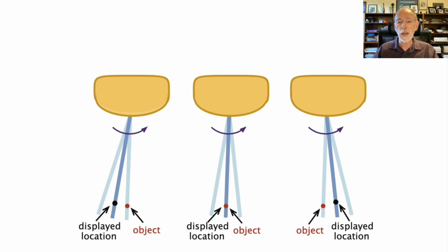The machine will display the object at the correct depth, but it doesn't know that the echo has come from the side lobe, and it therefore displays the object as if it came from the centre of the main beam. So it is being displayed some distance to the left of its true location.